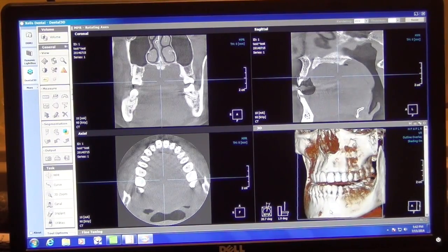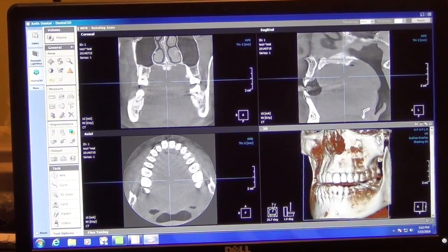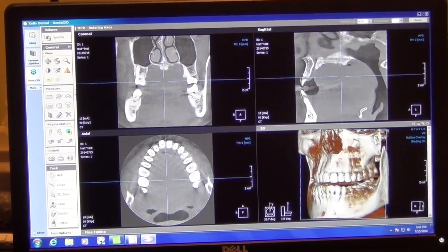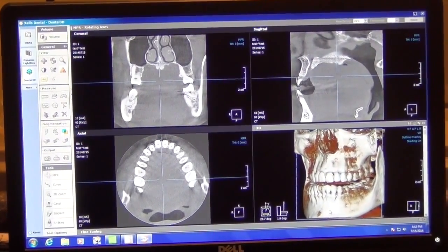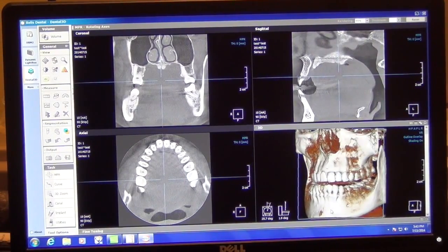Okay, do me a favor. Go through these tools slowly, on the left side. Just point and tell me what they are and sort of what they do, one by one. I know it might be a bit boring, but I'm sure they've got a purpose, and you might as well learn what they do.